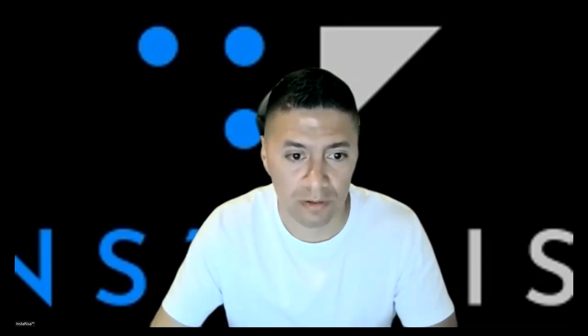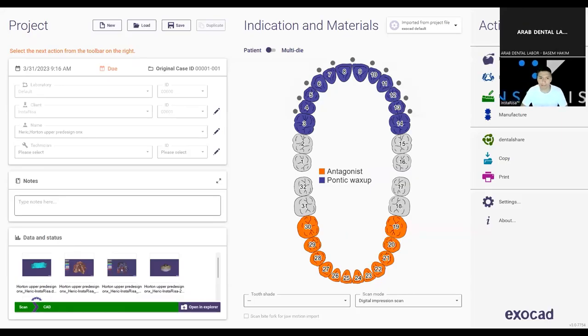So I'm gonna go to Exocad. There we go. Okay, guys, so now we have Exocad here. We open 3.1 DB. Here's where I'm gonna put the patient's name, the indications, and the materials, and what I'm gonna do with this case. In this case, in client, we have Insteriza, the patient's name, and I'm gonna name it pre-design upper All-on-X, and the technician.